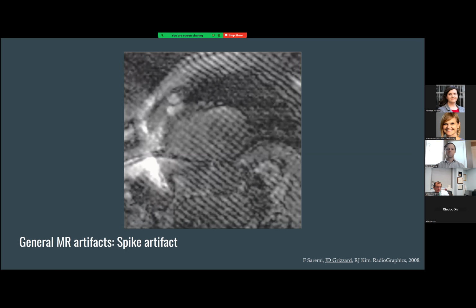So what's happening here is if you have a diagonal line in your image space, if you think about the Cartesian coordinates of your K-space, you have a point somewhere off of the main axis in one direction. So there's some component of X signal and some component of Y signal, thus causing this diagonal reverberation in our image. And the frequency and orientation will thus depend on where in K-space those points are affected.